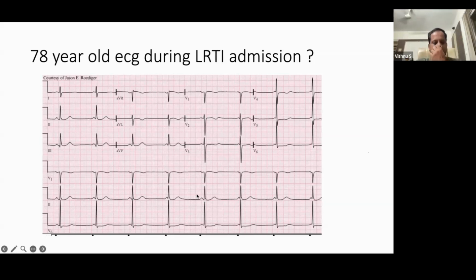In this case, this QRS is not conducted from the P wave fired from the SA node. This P wave is fired, and then the junction is fired. So the P wave and junction are competing. This is a type of AV dissociation, isorhythmic AV dissociation.